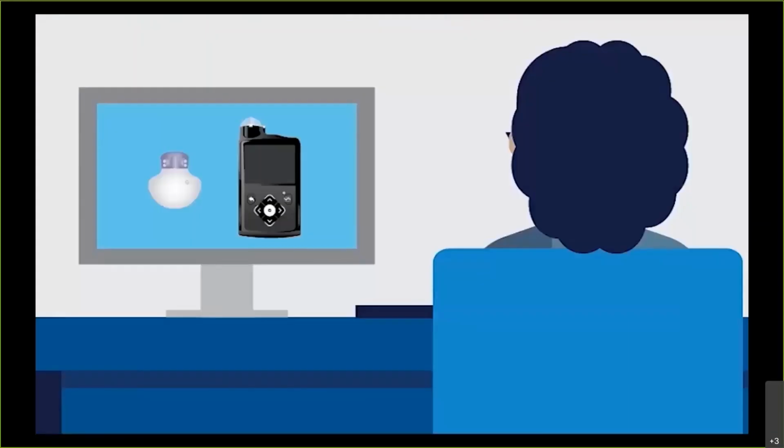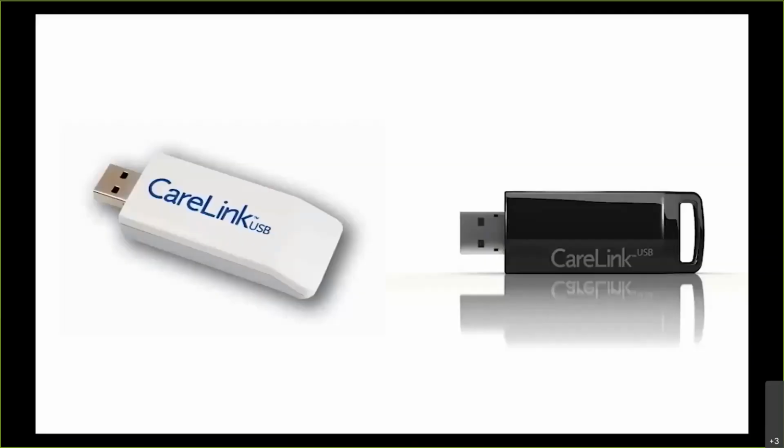Uploading your device data to CareLink personal software allows you to take a more active role in managing your condition and allows you to share your data with your healthcare professional. To begin, plug in your CareLink USB or the meter that came with your insulin pump. Use the white CareLink USB for Paradigm pumps or the black CareLink USB for MiniMed 600 series pumps. It may take a few seconds for your computer to recognize it.